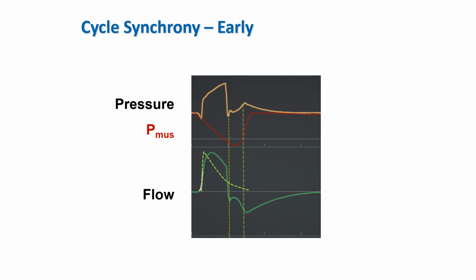And the way you fix that is how? What do you think you would do? Well, you just lengthen the inspiratory time. Or you allow the patient to cycle off by themselves and not have a mandatory breath here, just have a spontaneous breath.